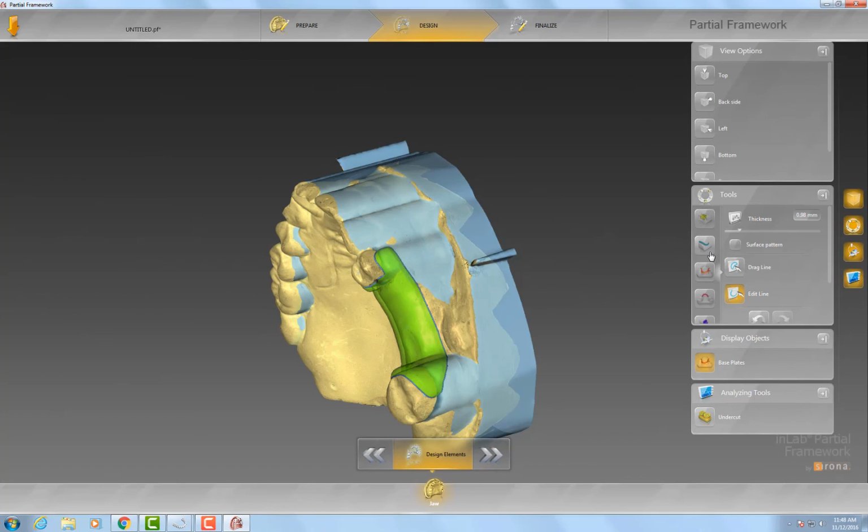So after that, all I really do is I will find... There's a pin in here. Where did it go?